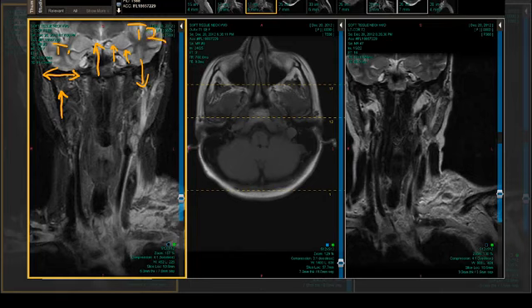And how long does that take to happen? Anywhere from 12 to 36 hours is the range. So we're so early that we don't see the intracellular deoxyhemoglobin shortening effect in the vessel very well. Now sometimes on the T2, you'll be somewhere between here and here, going from high to low. So at some point, you're going to get some signal that's gray on T2. So it might be gray on T1 and gray on T2.